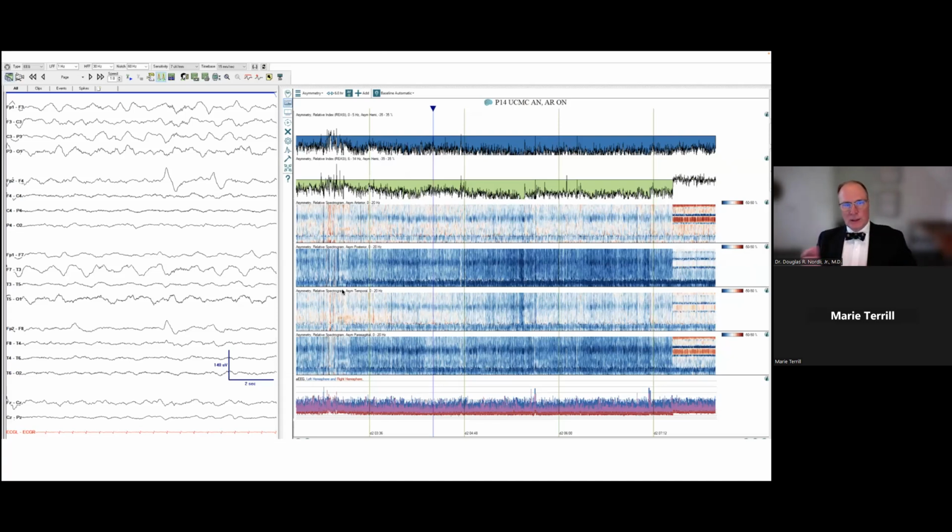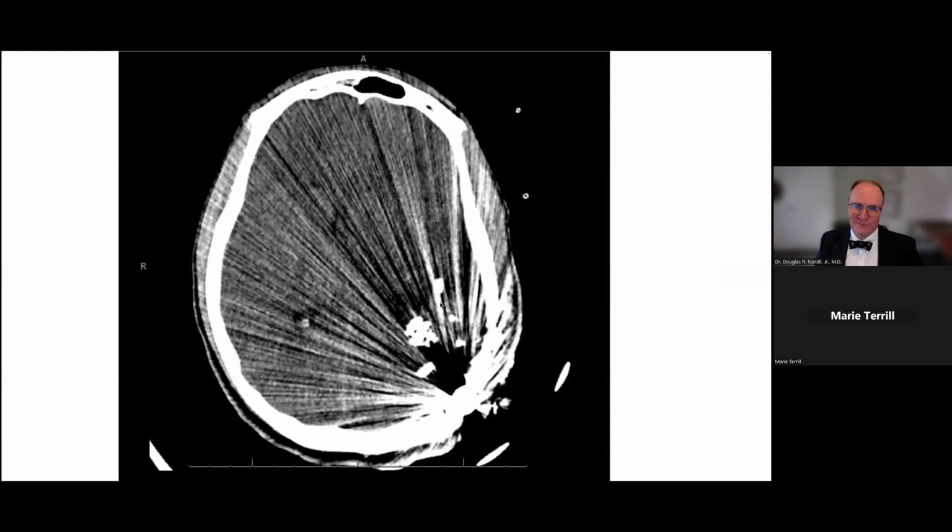So here, let's take a look at this. And you'd say, okay, let me take that back. It's not interpreting the trends, it's interpreting the EEG data in total. So here we see higher amplitude activity on the left, and it looks like better high frequency activity is evident over here on the left, and relative diminution. So our old EEGers rule is generally go with the side of attenuation. And the trend analysis is showing us the same thing, saying like, wow, a lot more voltage is evident over here on the left as compared to the right. But sadly, this was due to a gunshot wound, which sadly, again, we see way too frequently nowadays. And of course, this caused a massive breach effect, which was resulting in that asymmetry. So the side of attenuation is not always the side of pathology.